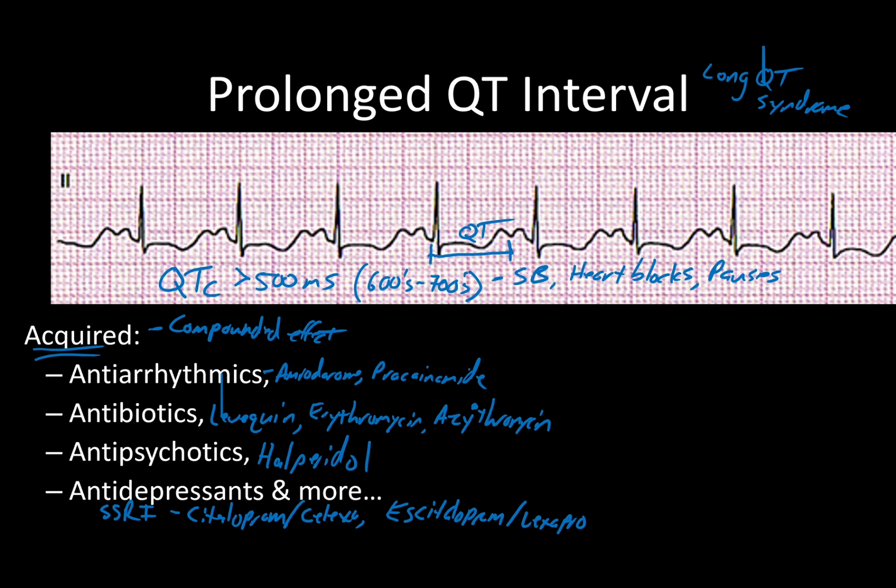The big reason why I'm going over all of this is that if this gets long enough, it will cause a very specific type of V-Tach known as torsades.